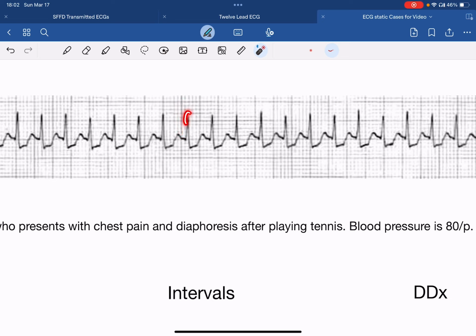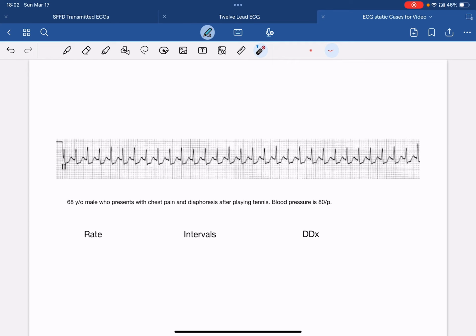Because we have another R wave, or R wave number two, right here, a little bit after this big box, we know that the rate is less than 300, but it's definitely greater than 100. And we can even further deduce that the rate is between 300 and 150 times a minute. So for the purposes of this, just based off of the proximity of these intervals, I think it's safe to say that the heart rate is about 200 times a minute.